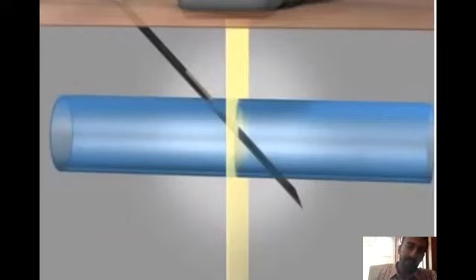Obviously, the concern of not doing the fanning technique is that by keeping the ultrasound probe stationary, your ultrasound plane itself is stationary, and you may actually miss the needle tip. As this cartoon shows, the needle tip is actually through the vein, but your ultrasound image will look as if the shaft is in the venous structure itself, simply because you haven't adjusted the ultrasound plane to follow the entirety of the needle, in particular the needle tip.